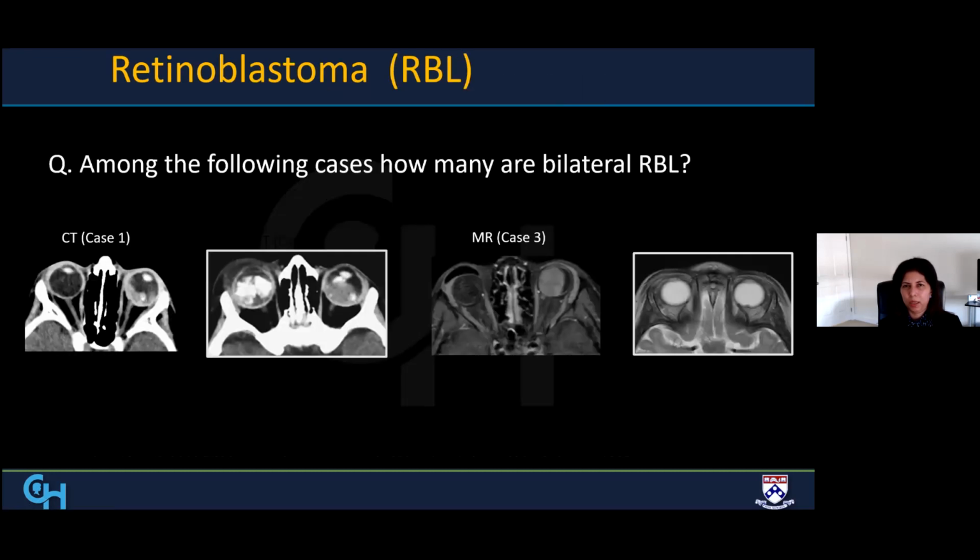Now, I have a question here for you. These are 4 different cases of retinoblastoma. I cannot see you all, but you can just ask yourself the question: from these, how many do you think are bilateral retinoblastomas? I will just pause here for a few seconds. You can take a look at these 4 different cases. Which ones do you think are bilateral?